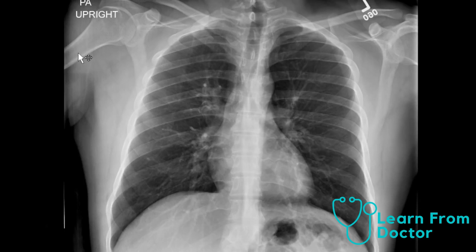So what I do is I start up at the right shoulder, so I take a look at the right humerus, on into the glenohumeral joint, follow down the scapula, take a look at the distal right clavicle down to the sternoclavicular junction, followed on to the left clavicle down distally, take a look at the scapula and to the glenohumeral joint on the left, and any portion of the visualized proximal left humerus.